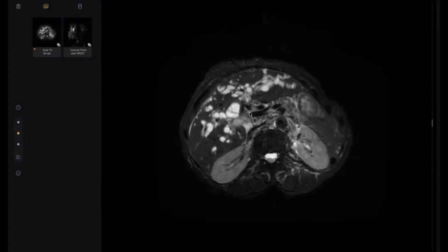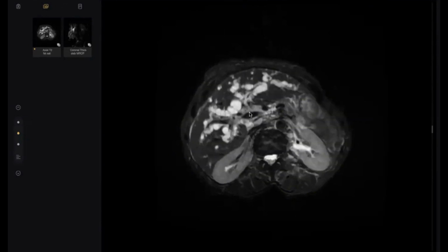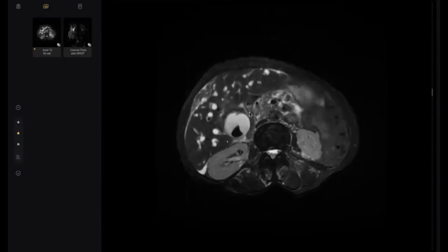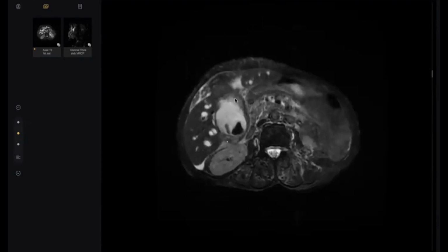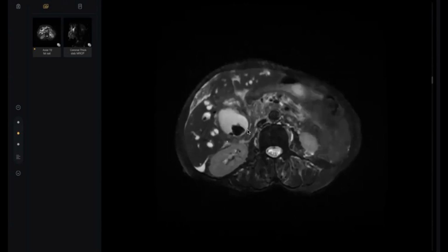From where did this soft tissue come? Maybe from here, the gallbladder. See, it is almost connected with it. And the gallbladder shows non-uniform, like here, non-uniform mural thickening. So this is carcinoma of the gallbladder infiltrating the porta hepatis and involving the biliary system.